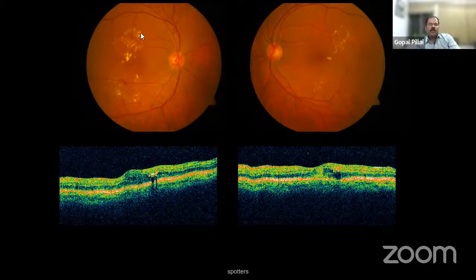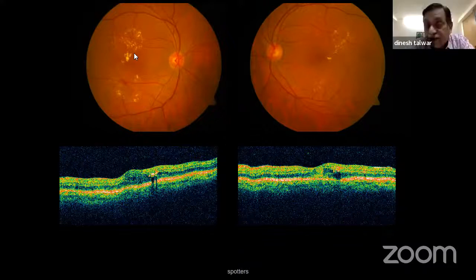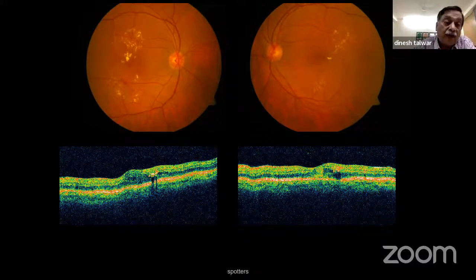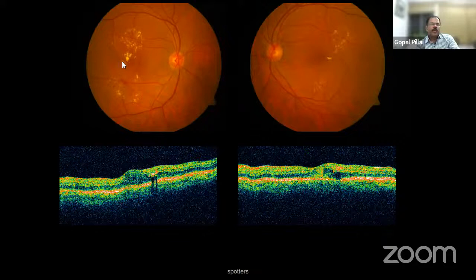Okay, this is the macular edema, which is about one disc area. This is one disc area. This is more than one disc area in size. Is any part of it lying within one disc diameter of the center of the fovea? Yes, sir. Actually, I can't show my pointer. You see the very dense hard exudate, and you go temporal to that, above. There is macular edema there also. This much area is macular edema. So this whole thing is.